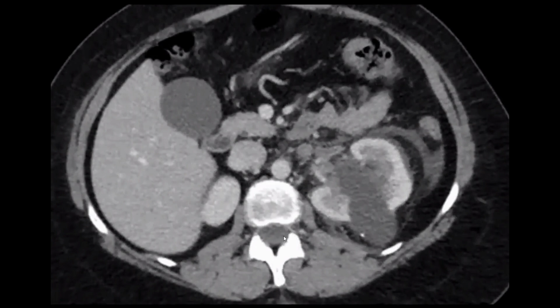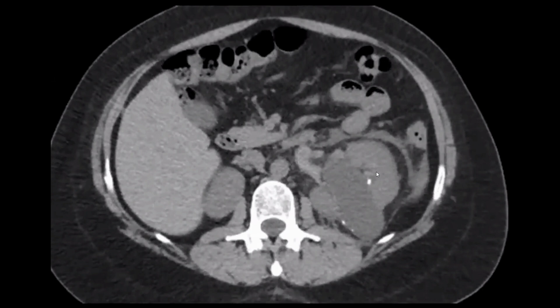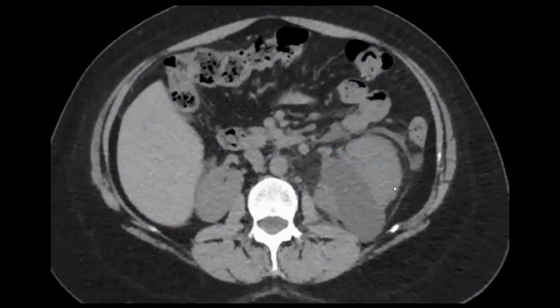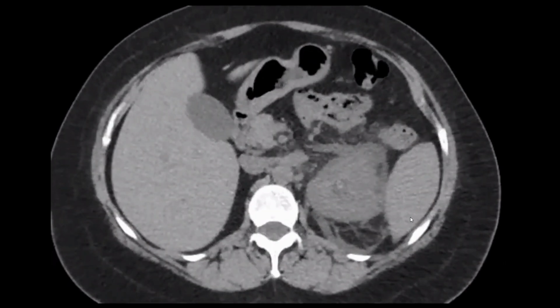Again, if you see the non-contrast study, the left kidney is swollen with perinephric stranding and thickening of the fascia and minimal fluid collection at the pararenal space. Also we have a hyperdense vascular structure at the left renal sinus, continuous with the left renal vein.